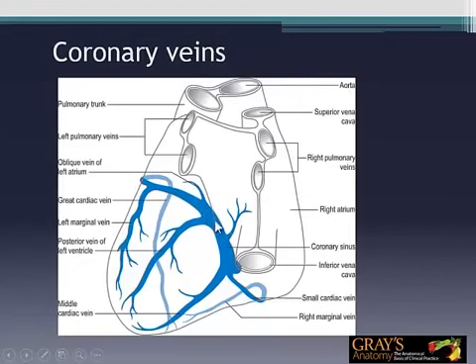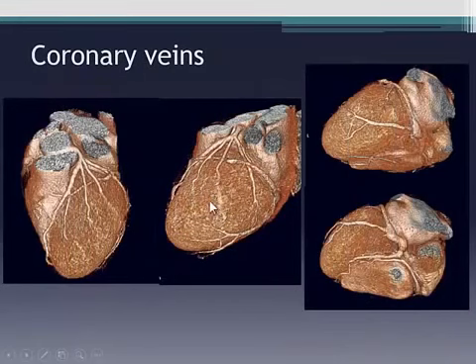So you've got the coronary sinus, obviously you've got the great coronary vein, those are the easy ones. And then I can never remember, is it the middle, or is it the right, or is it the lateral? Okay. But if you're going to do venous anatomy, especially if they're talking about putting in biventricular ICDs and they want to know, is the venous anatomy normal, or is it varied? You can use CT, but again, you have to modify the way you give contrast because you don't normally get opacification of that, which is why I don't know it, obviously.